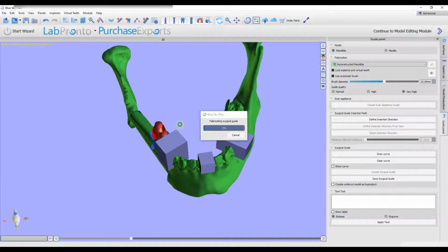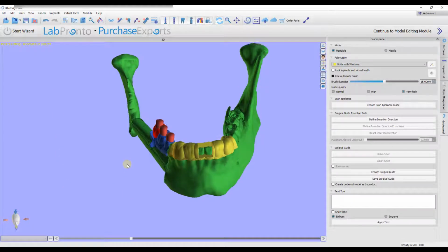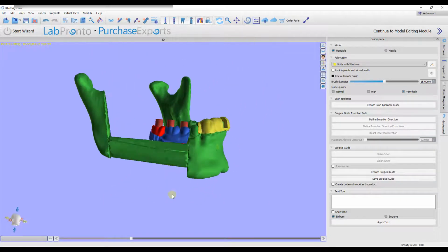create this guide. And now this is the part, it'll take a minute or two, and actually it can take a few minutes here. This is the lengthiest part of the process, and I'm gonna actually let this run and pause and come right back. And we're back, and this yellow stent is what we've just made here.